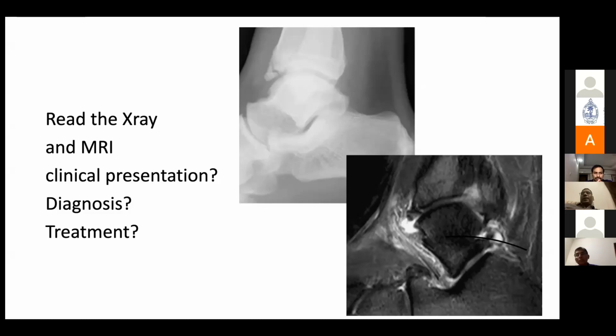Okay. Can you see something on the anterior aspect of the tibia? There is a fracture. Osteophyte, sir. Anterior osteophyte. Yes, what we usually call a spur-like growth on the anterior aspect. It could be an old fracture or an osteophyte-like growth. The patient presented with pain. So this is the X-ray. What is your diagnosis?